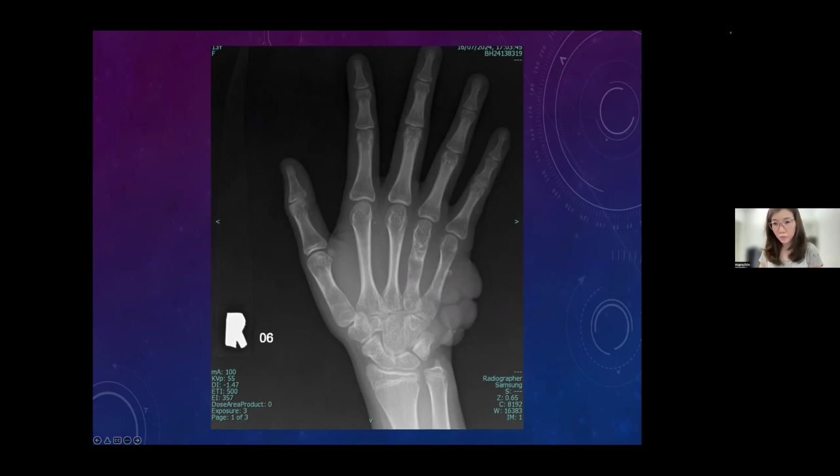Any more answers from the floor? Hurry up, guys. We are running short of time already. I still have multiple X-rays to show. Okay, faster, faster. Anybody? Nobody. Okay, so you see there's a soft tissue nodule. Good. This is the hand X-ray. Wrong group. This is the ganglion, a good guess, but it's not.